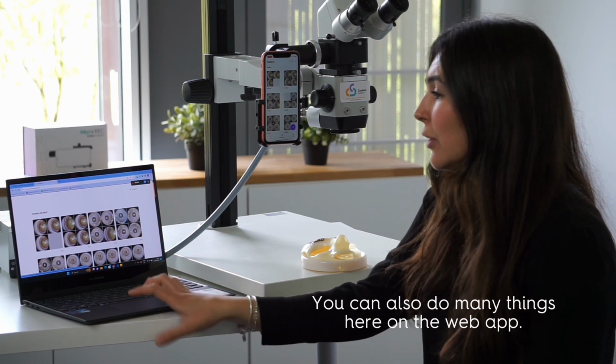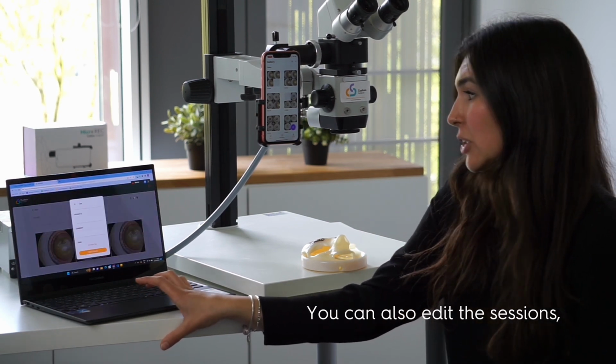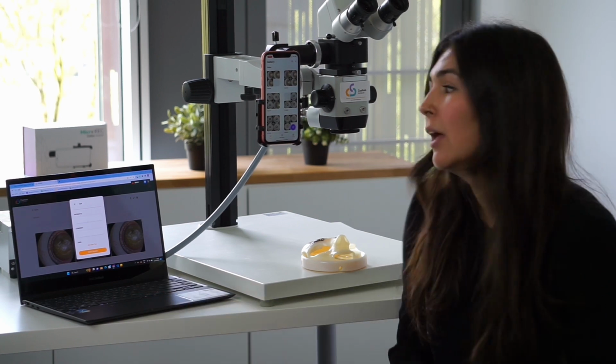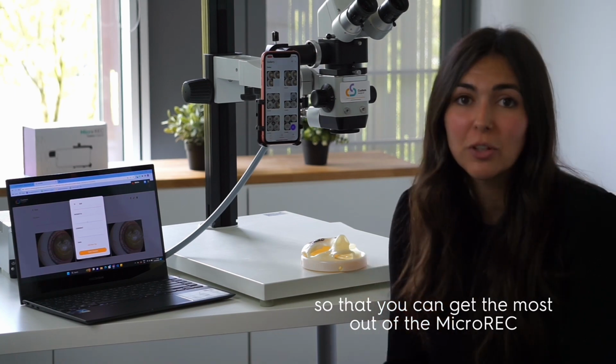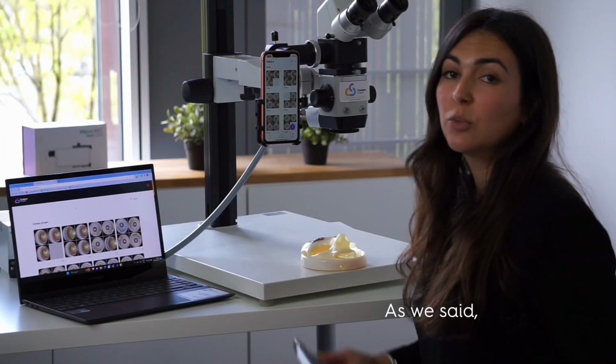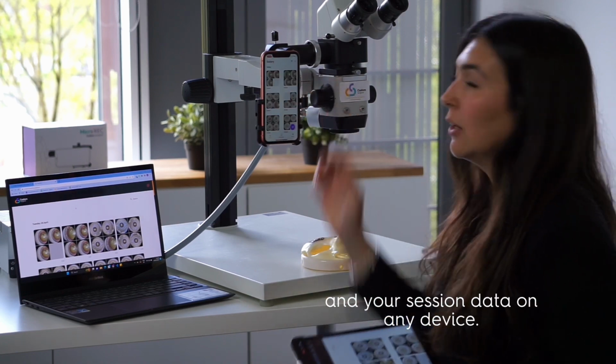You can also do many things here on the web app. You can also edit the sessions, so you can add the patient ID, different comments, different tags, so that you can get the most out of the MicroREC and the MicroREC app. As we said, MicroREC Connect allows you to check your images and your session data on any device.